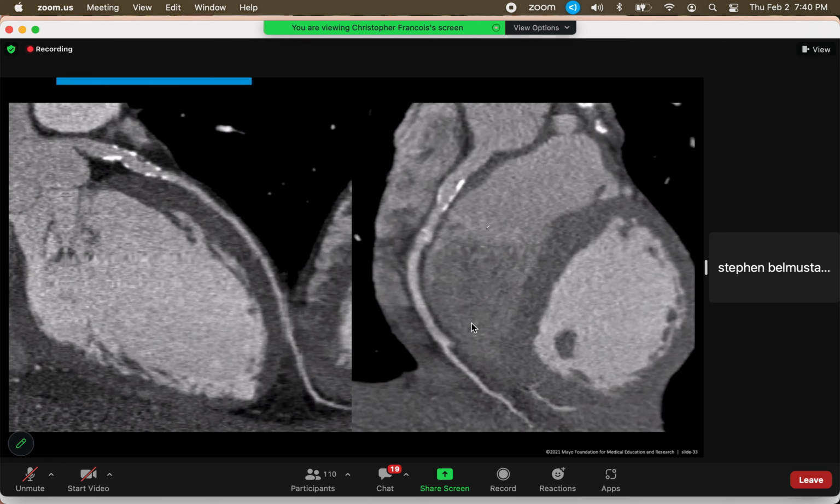I'm wondering if there's kind of like little aneurysms, like distally. Yeah, there is some ectasia. Like, so the proximal right coronary artery, this was about 8 millimeters, and similarly for the proximal left coronary artery, that measured up to 9 millimeters. So we have some calcifications, some non-calcified stuff, aneurysms.